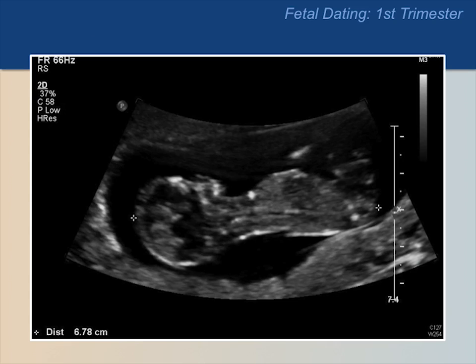Please pause the video now to invite a volunteer to assess whether a crown rump length can be accurately measured using the fetal position, profile, and caliper placement in this image.